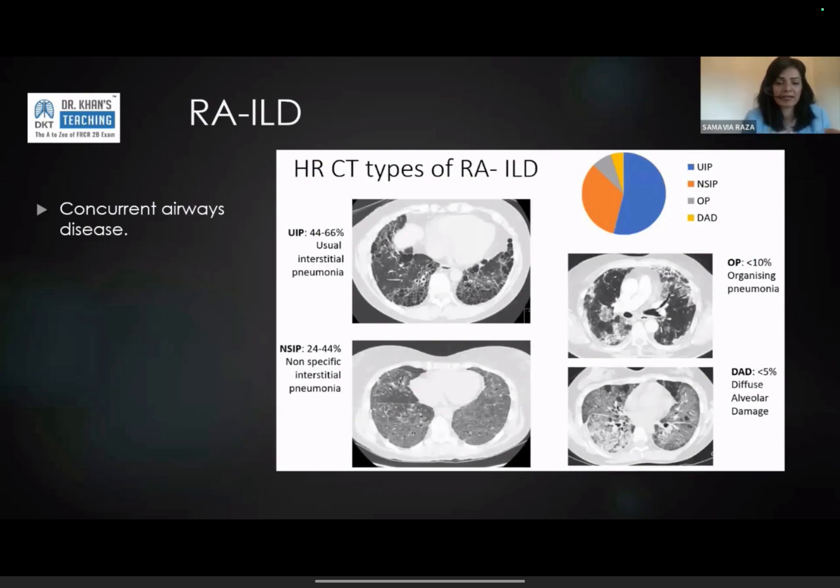So it looks a bit like bronchiectasis, the thick bronchi, inflamed bronchi. And when you have inflamed airways, you get infection. So superadded mild infection, atypical infection. The infection comes as tree-in-bud nodules, so fluffy looking nodules, dirty looking lungs. Dilated bronchi, thickened bronchi is the airway problem of RA. So RA related airways disease.